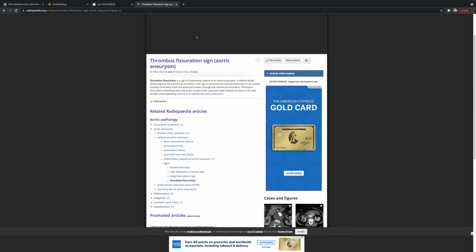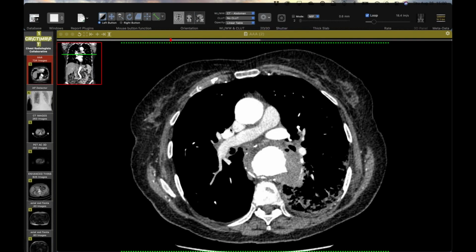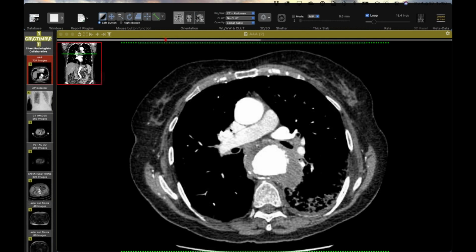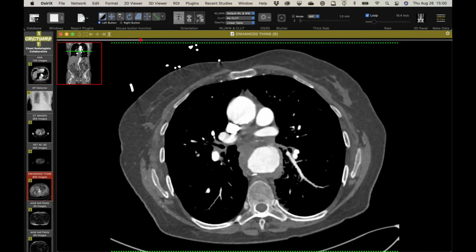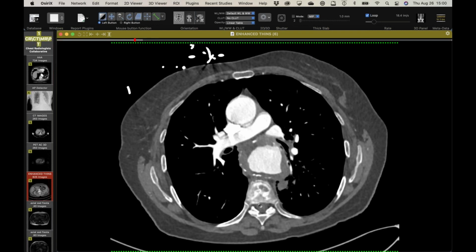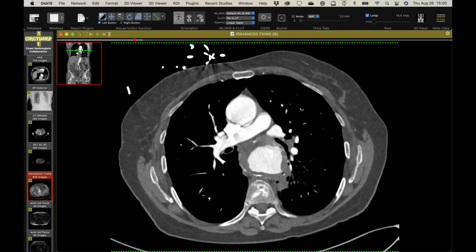Can you go back to your imaging? I want to see if it had that acute. Absolutely. Yeah, so this is when the patient presented. On that image, you see how it's acutely pointing into the. Yeah, that's what I didn't like. To me, this is not normal. And I think there was something like that on the prior imaging too. It kind of caught my eye. Yep, right there. Some pointy. Yeah, interesting. That was 3 months earlier. So it was probably slowly, and even there, it looks like it already got into the lung.